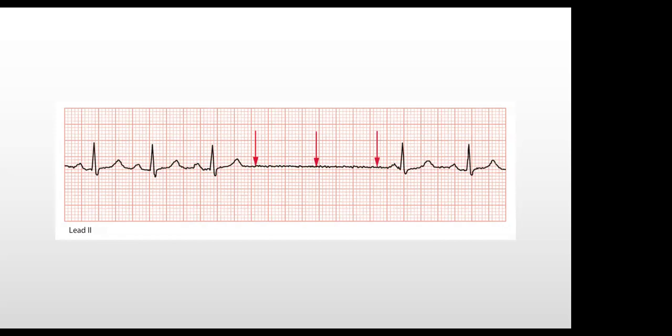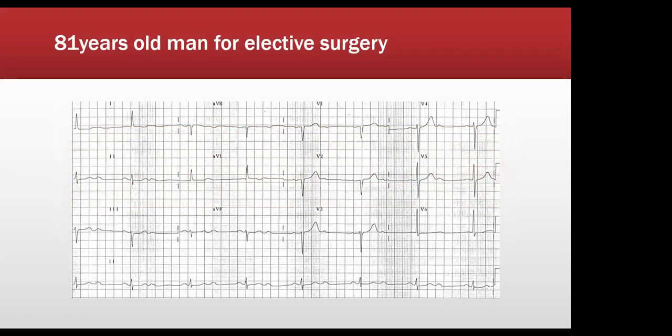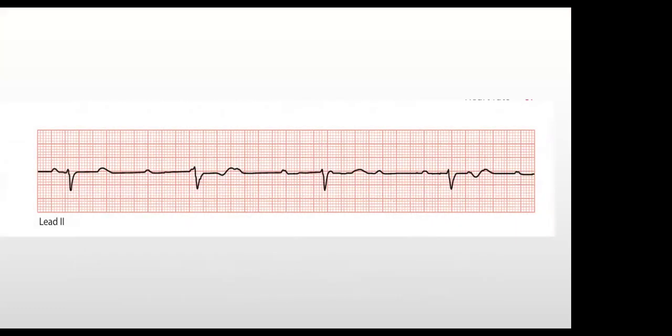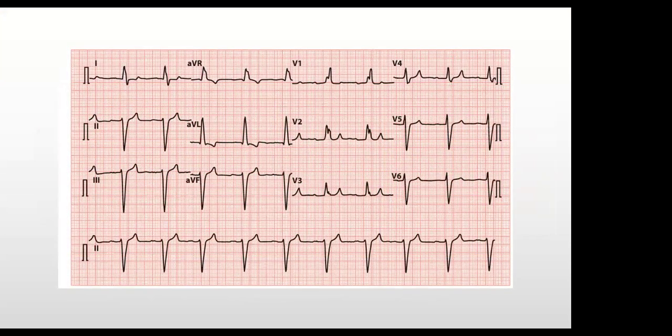This is what? Sinus. How's this? Sinus block. 3, 4, 5, 6, 7, 8. Is it more than 3? No. 2, 3, 4. So if it's less than 3, that's a sinus pause. More than 3, sinus arrest. Again, we've seen this before.